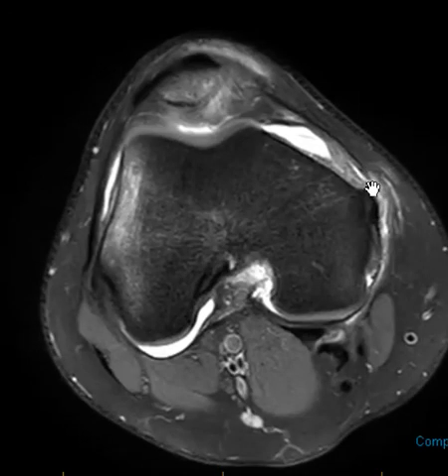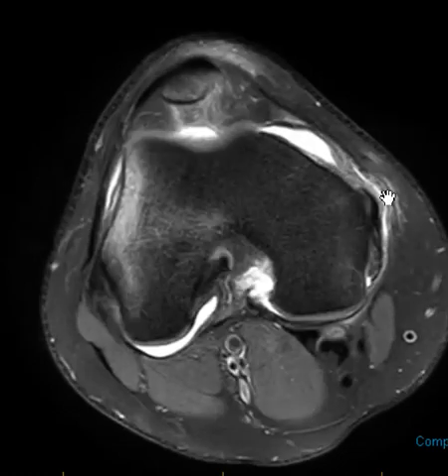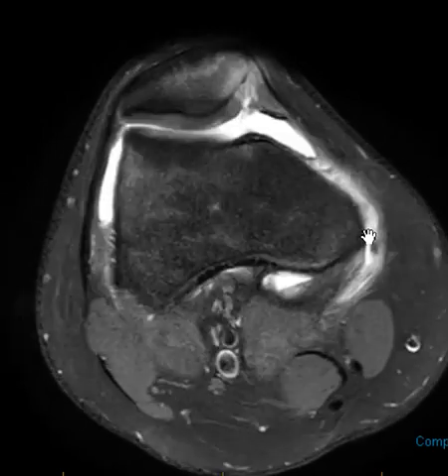And it looks like it's torn here as well, and a little bit of fluid is leaking out underneath that tear and going along the medial joint line. A little bit of a sprain of the medial collateral ligament, which is right here as well. So common findings, very classic example, and that's it.